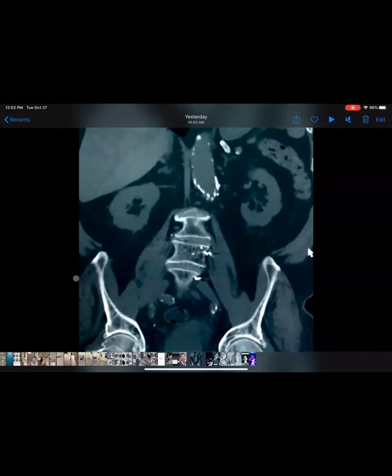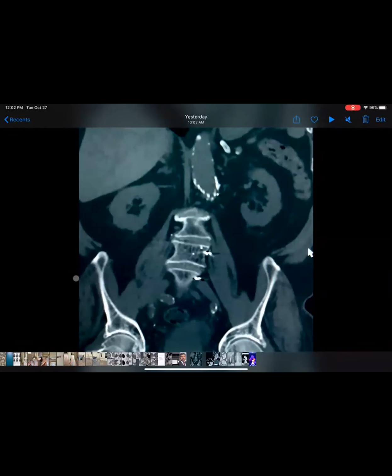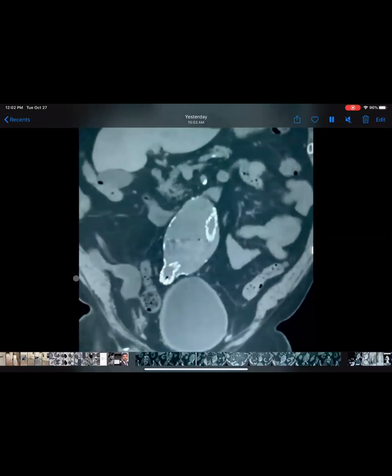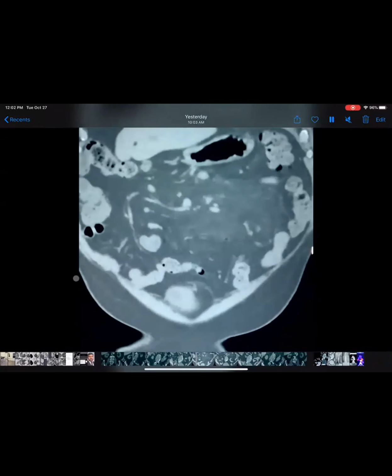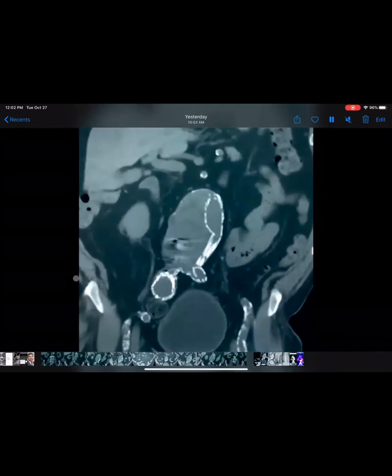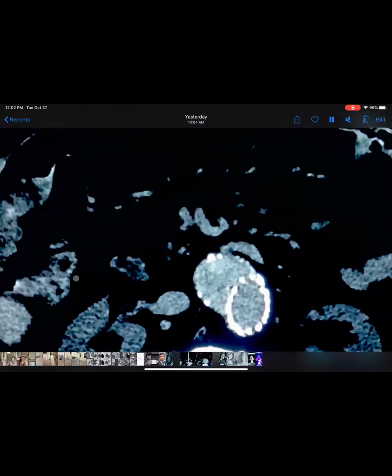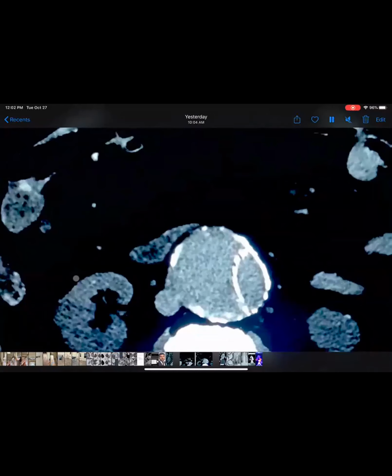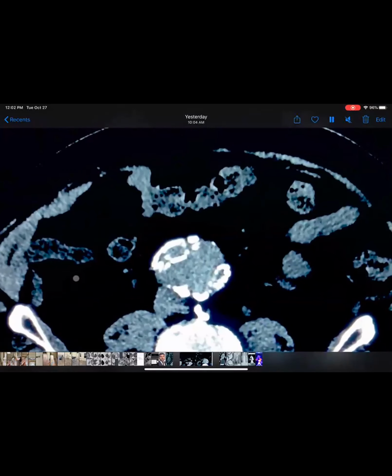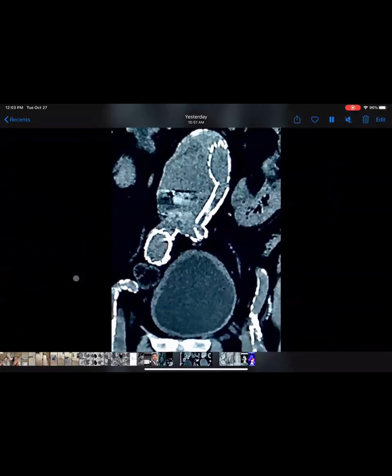And then our surgeon usually does it without contrast. Let me just run it again. And this is one of the studies as a surveillance. And then this is the axial view. I hope it shows okay. I try to change the window levels. Again, it's a non-con.